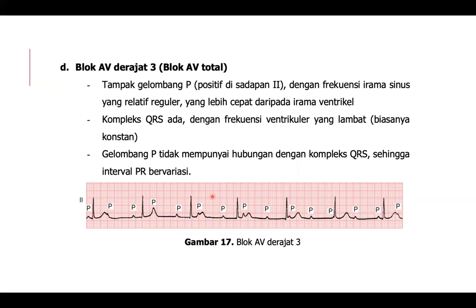Finally, the total AV block or third degree AV block. Students, we can appreciate that there is no connection between the P wave and the QRS. The P wave rate is different from the QRS complex rate. So this is the total AV block.